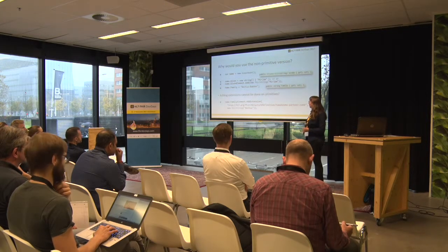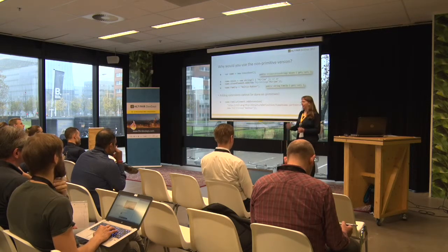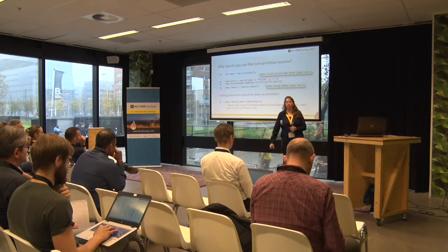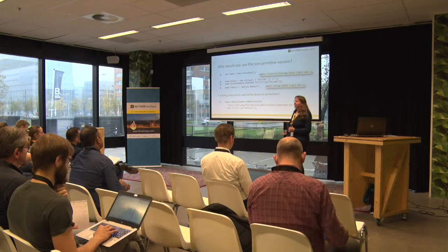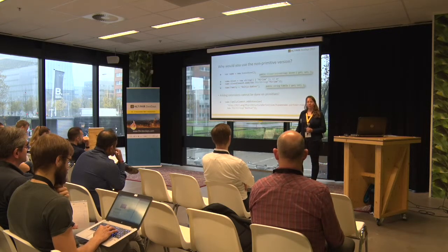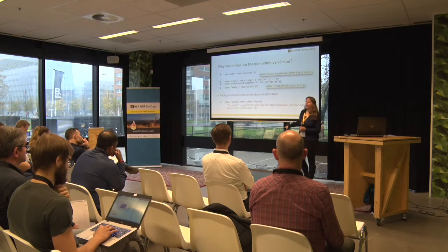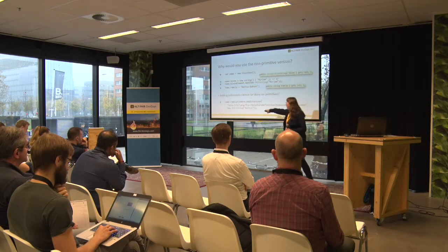In the Netherlands, we would like to break apart the names. That's a really nice thing we want, where we have extra bits in front of the name, or in this case, my name consists of 2 names. And I could create an extension, but I need to have the family element part, because I can't extend family. That's a simple string. Family element gives me the opportunity to add extensions to it. And in this case, what I've done is I have indicated with the Dutch defined extension for the partner name that my partner's name is in fact the first part of the name I normally use.